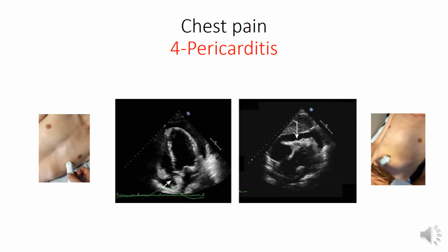This is from the safety point of view, because when we are at the cath lab doing aspiration for the effusion, if we measure at the systole, where the effusion is at its maximum diameter, we might get overestimation of the effusion, and perhaps we might get the RV wall injured because it is too close to our needle. So when we measure effusion, we measure it at the end diastole.